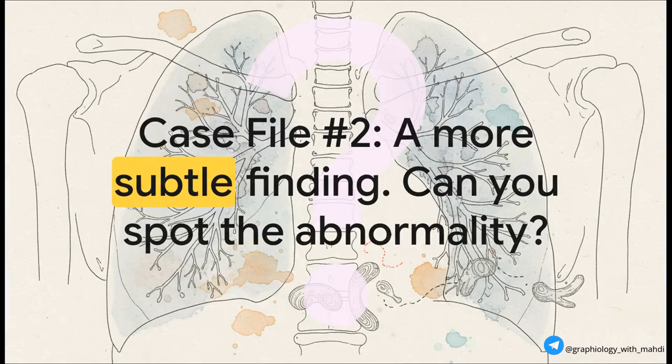Okay, that last one was a bit of a party trick. Most findings in radiology are way more subtle than that. So let's try a more realistic case. There is an abnormality in one of these lungs.